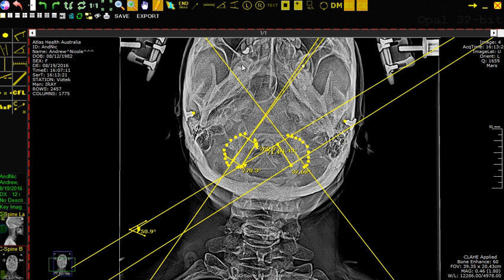Point is we've got a couple of lines now which represent the long axis of the joint right here, which is represented by this angle, which again is going way farther than we need it to, and represented by these two angles, which should be one, but for demonstration purposes, again, I showed a different way of doing it. Now, this is all well and good, having these measurements, but we need it in reference to something, and that's again why we had these two earplugs here.